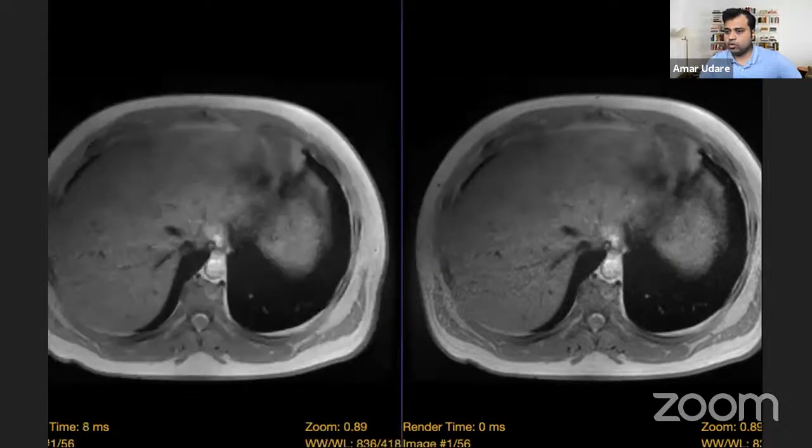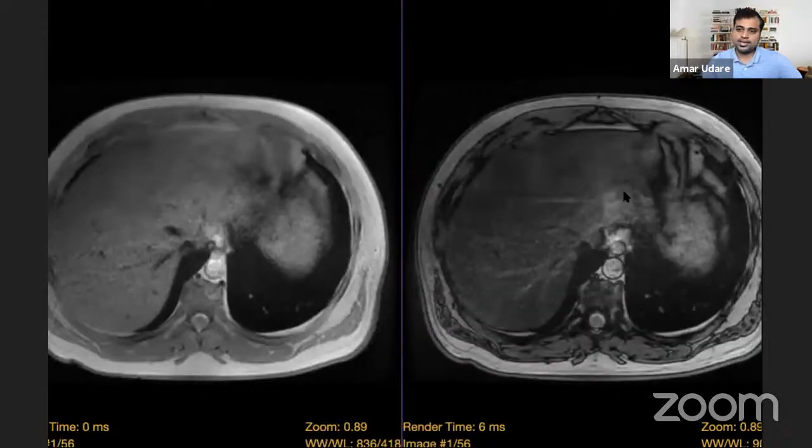Okay, so when you're reporting MRs for adrenal lesions, what is the one sequence that you need to look at? The key sequence. Yeah, excellent. So Selda and Jishan have rightly pointed out, in-phase and out-phase sequences help us to distinguish if the lesion has intracytoplasmic or microscopic fat. If the lesion has macroscopic fat, that will be a myelolipoma.